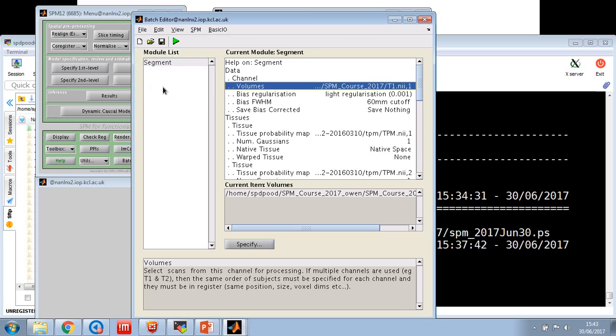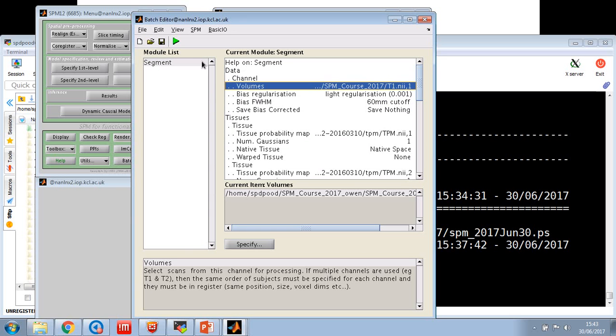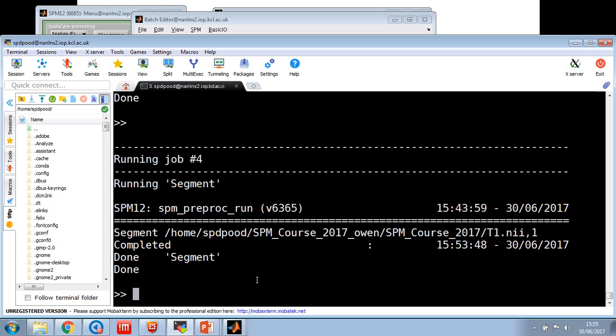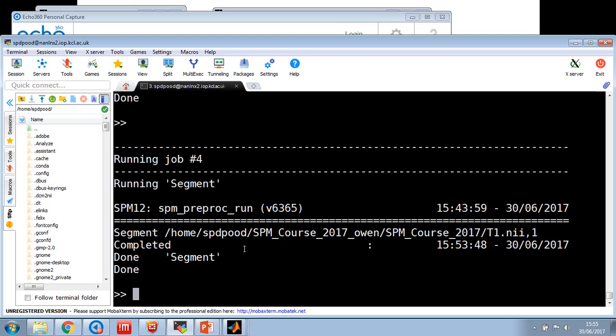Okay, so we'll save the batch again. And we'll just call it segment. And then we'll press play, and I'll pause the video again. Segment. And with that, we press play. And I shall pause. Okay, so as you can see, segmentation is now complete.